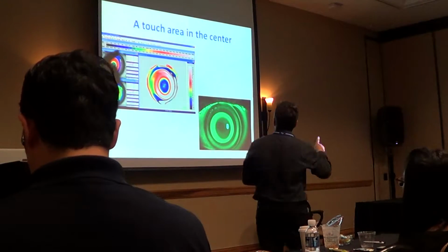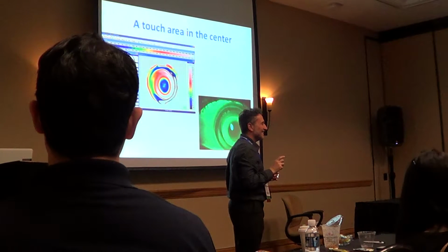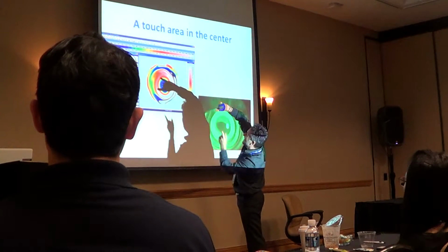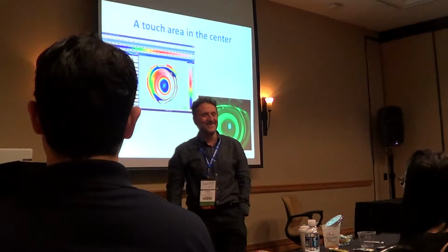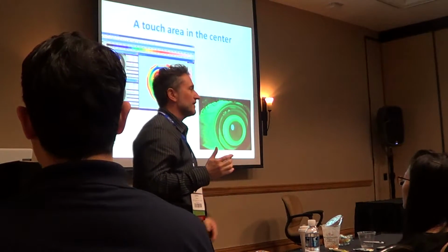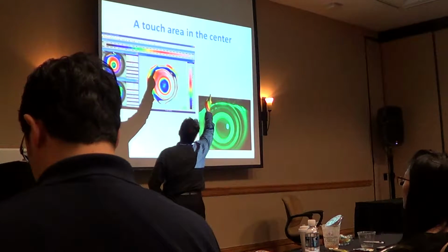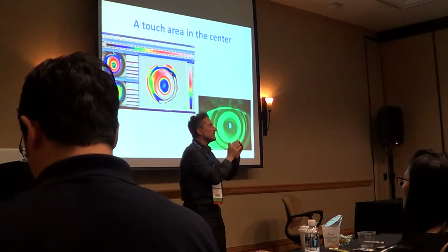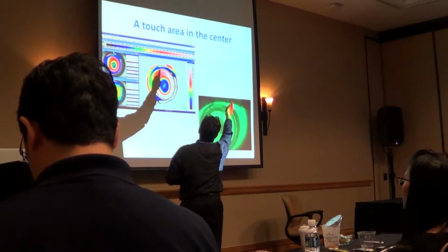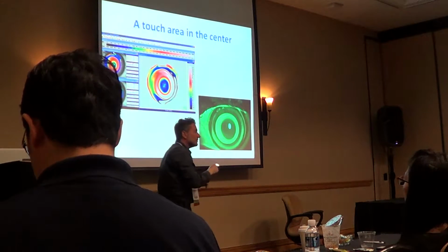I call that the croissant. A crescent, yeah. So you have one here, and you have the crescent like this, right? When you have the crescent, you have pressure on one side and no pressure on the other side. You have a red ring here, and this is the outer ring. Remember, two red rings couple together at the end. So the inner red ring is this one, and the outer starts here and will arrive like this. But it's not, because there is no pressure.